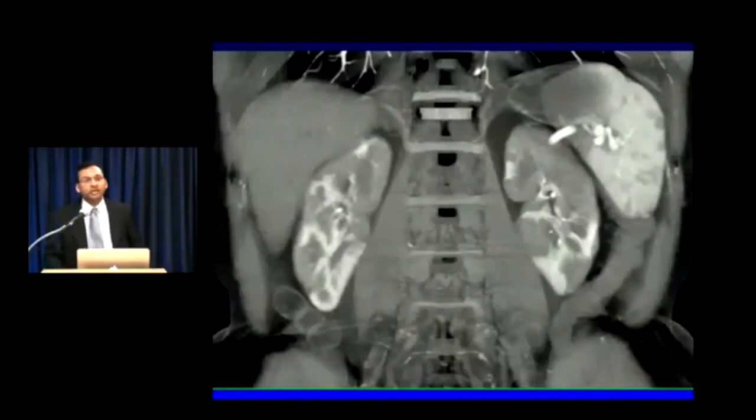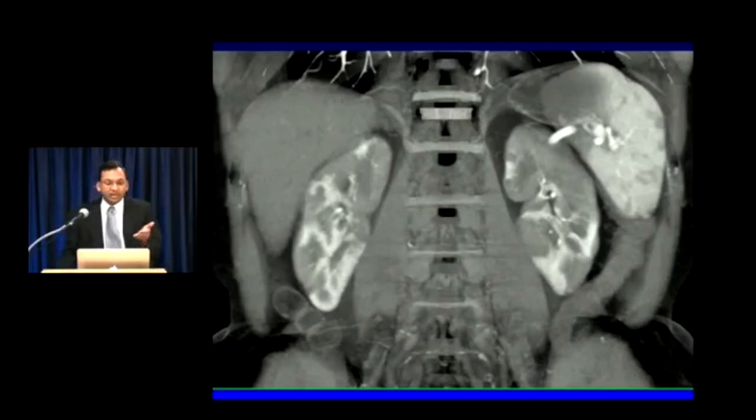Now, as I mentioned, there's often going to be evidence of other IgG4-related sclerosing disease. In this case, this is one of the more common manifestations that I've seen in my own practice, these unusual lesions in the kidneys. They can be mass-like, they can be wedge-shaped, usually hypodense, and people don't exactly know what these are, whether they're infarcts, ischemia, focal inflammatory masses. Regardless of the cause, it's actually not that uncommon. So anytime you see these other manifestations, at least consider whether your pancreatic findings don't necessarily reflect acute pancreatitis or conventional pancreatitis, but rather autoimmune pancreatitis.